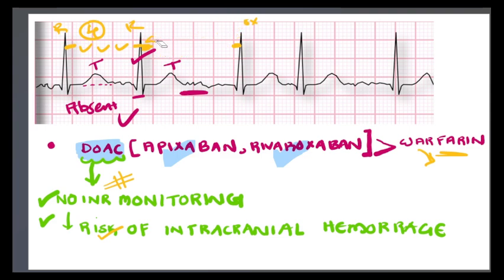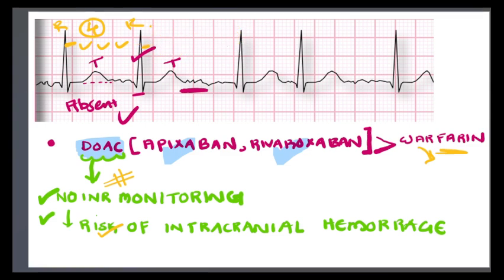So let's take this side. Again, this is an R wave, this is an R wave. Here, one, two, three, four. We have almost five boxes over here. Again, if you take here, we have only three. So there are three large boxes over here, here five, here four. So this irregular interval means irregular heart rate.